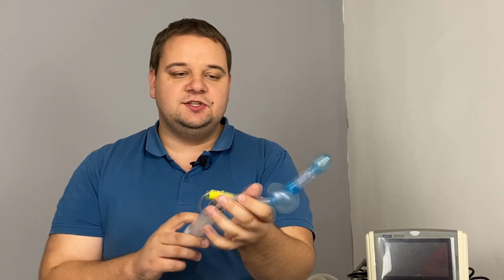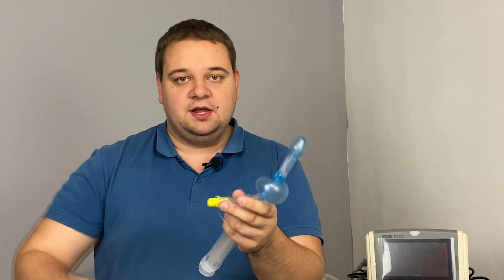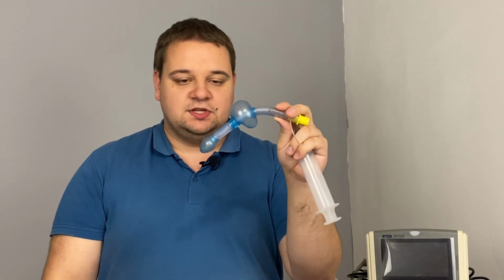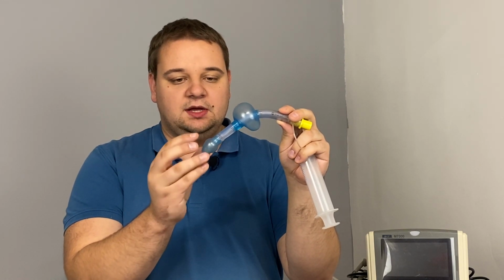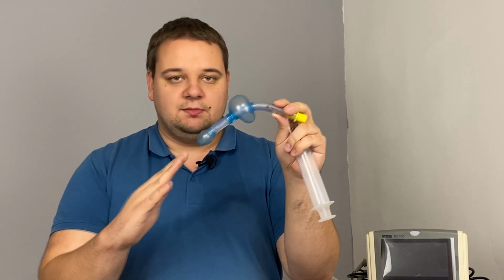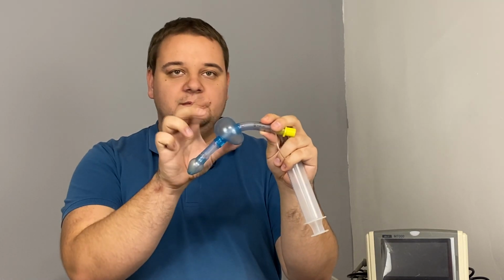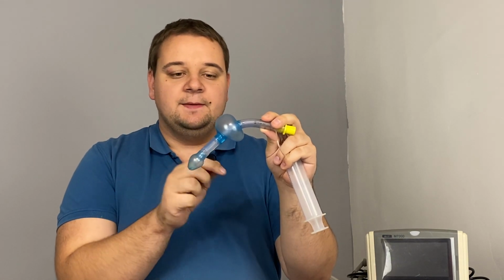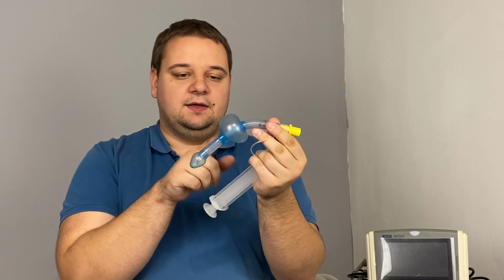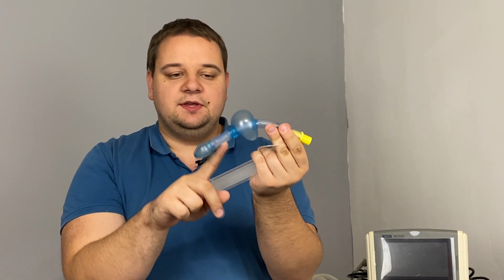the cuffs. There are 2 cuffs that are inflated together, and you can imagine, if you remember the anatomy of the airway, that when they are in the patient, the inside part, when inflated, will obstruct the esophagus, and no contents of the stomach will come up. Then this upper, more outside cuff will block the tongue, so that the tongue will not slip. And it leaves us with a rather secure area, and when you blow air in, you blow it here in this yellow connector, and it comes out here from the side.